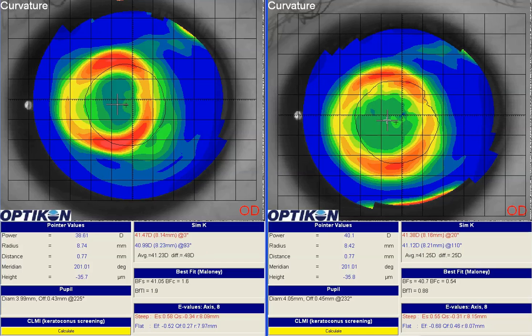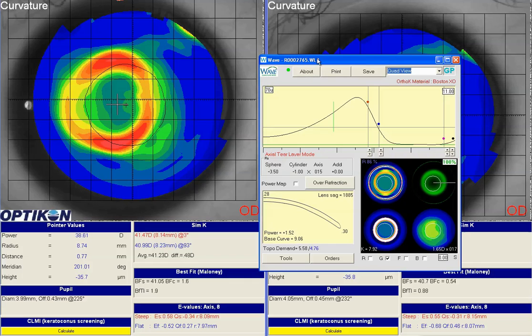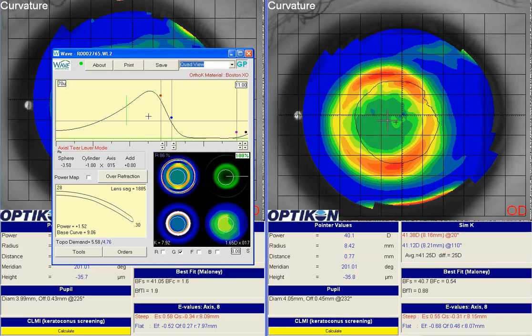So if this is a repeatable treatment, I'm going to bring up the lens that the patient is wearing right now. Then I wouldn't adjust anything to the fit, probably just build the diopter in to the power, and 5.8 and 6.4, which is okay. If this is a child and we're aiming for myopia control, sometimes I'll even go down to 5.6 and 6.2. But 5.8, 6.4 is not bad.